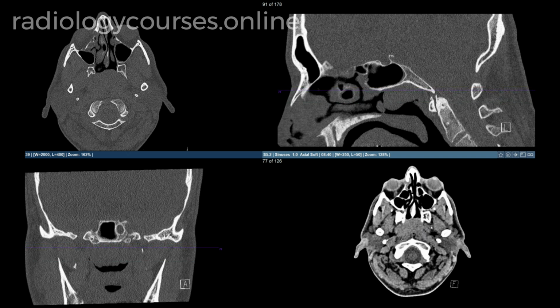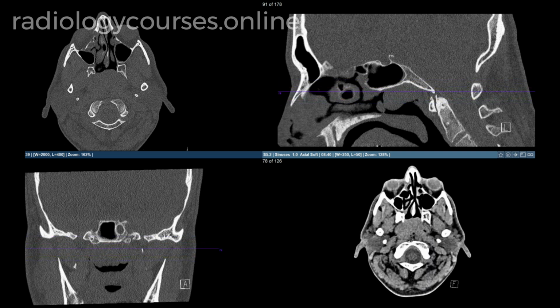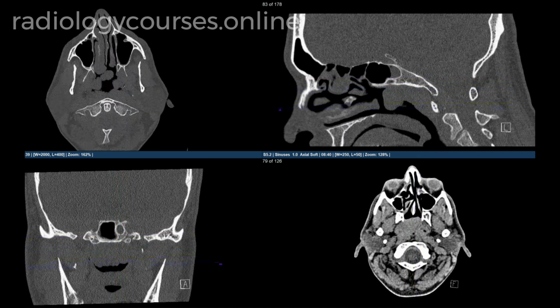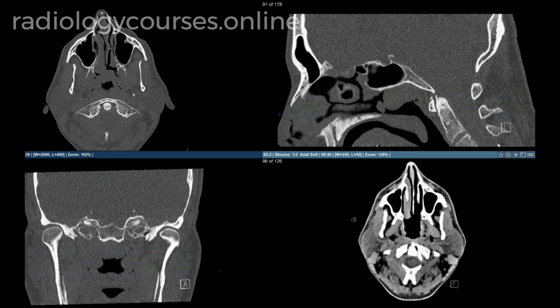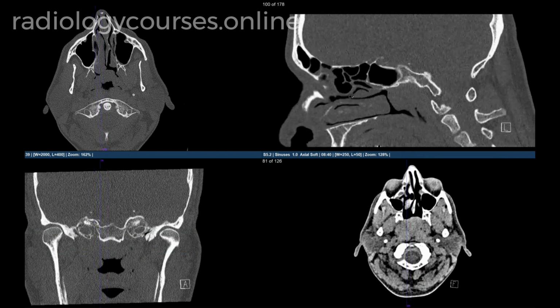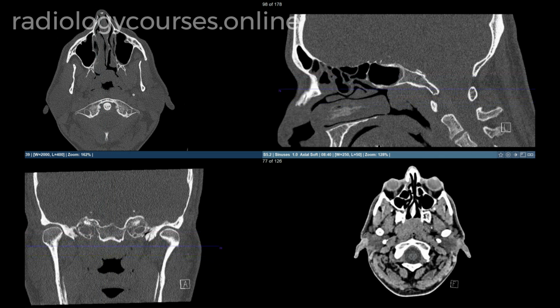We need to look carefully at the parapharyngeal spaces to see if they are bilaterally symmetrical or not. We need to comment on how large the nasopharyngeal mass is. In the conclusion, you can comment this may represent significant benign adenoid enlargement, but we also need to raise a differential diagnosis of a primary non-adenoid nasopharyngeal tumor such as lymphoma or nasopharyngeal carcinoma.